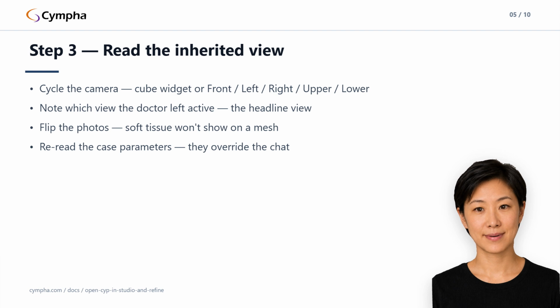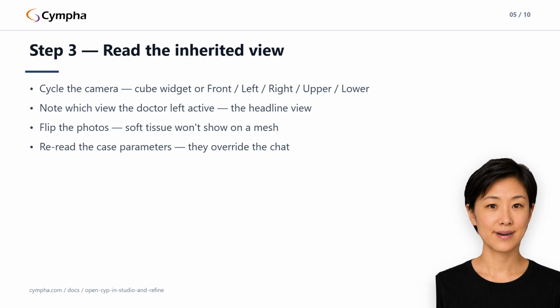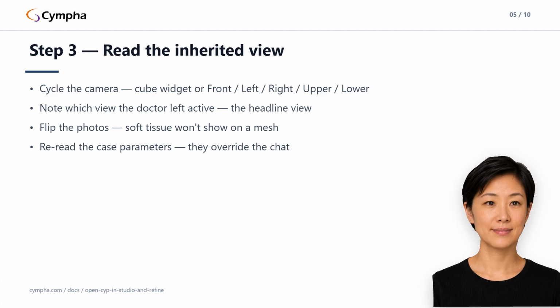before you spend 20 minutes in OrthoPlus designing the wrong thing. Now the handoff between the two tools, because they divide the labor cleanly. Studio is read and measure: cameras, photos, measurements, annotations. For tooth movement, you switch to OrthoPlus on the same workstation and open the case from its workspace folder.